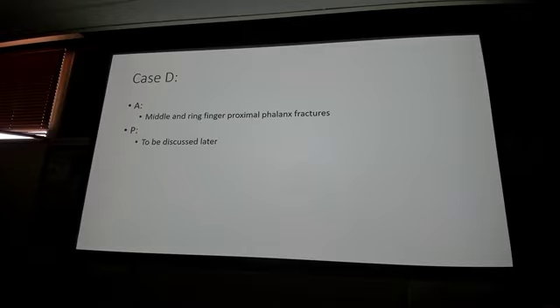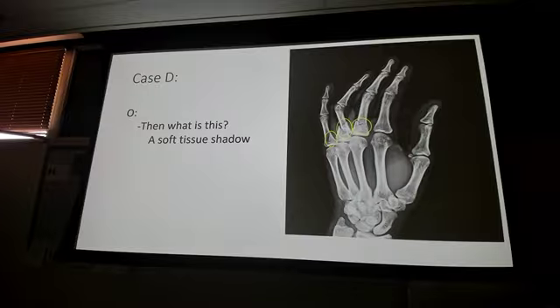Yes, sir. So did you say on that fourth digit that there's some shortening or am I bad? Possibly, I want more pictures. Yeah, there absolutely could be some shortening there, and to be honest, there is likely some displacement there as well, but I can't tell the direction with just this oblique photo. Yeah, good luck. What else we got on this one? Yep. Right.